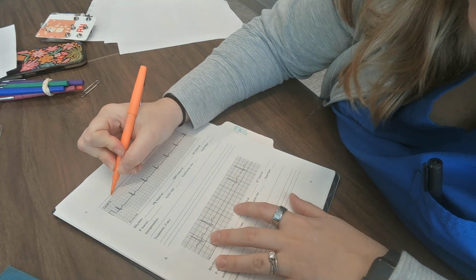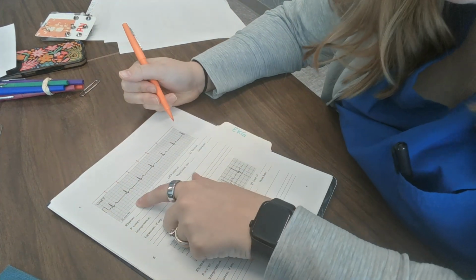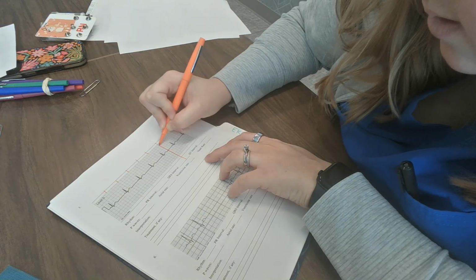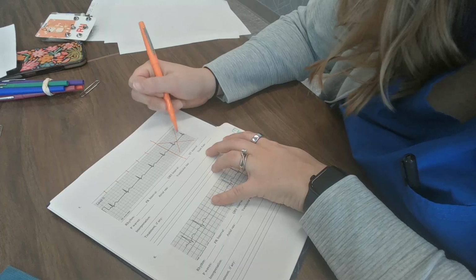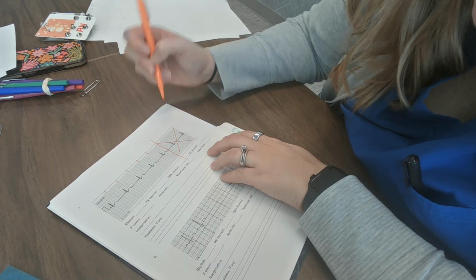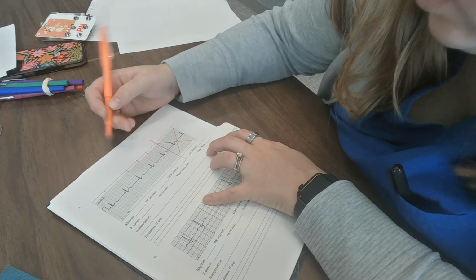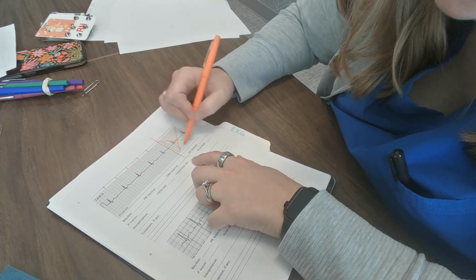So I've got a 1, 2, 3, 4, 5, 6. So this is not a 6-second strip, and you can kind of tell because it's zoomed out a little bit. So you're gonna stop here. And you're not going to look at this section over here because that's not part of our 6-second strip. So I apologize. I took this class over from somebody and I'm using an old packet and I didn't realize they had strips in here that were not 6 seconds. So just make sure that you're only doing 6 seconds. Okay. So we're not going to look at this.